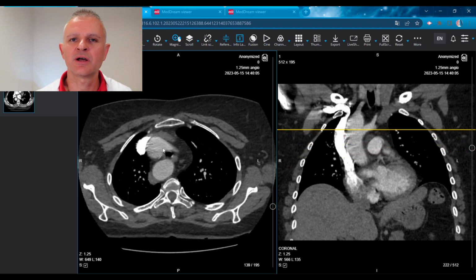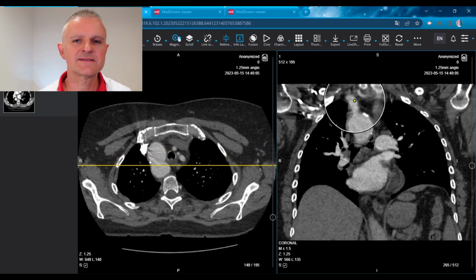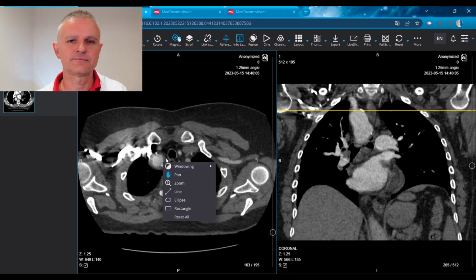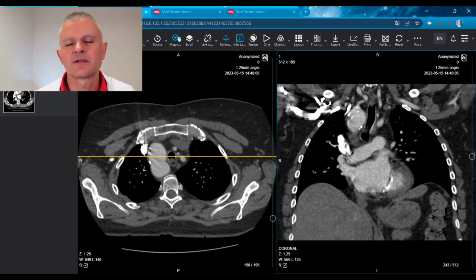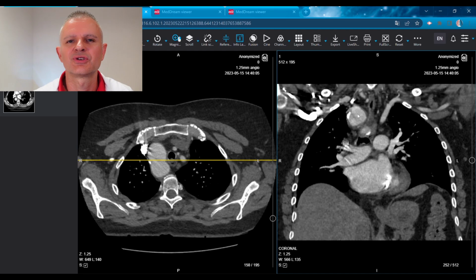So I guess from now on, it's no surprise that the next two branches are going to be the right common carotid and the right subclavian arteries, but these originate individually from the aorta as you would expect to see them under normal conditions, but on the left hand side. Also note that the vertebral artery on the right originates from the aortic arch instead of the subclavian artery, which I guess is an anomaly within an anomaly in itself. So that makes this case even extra special.